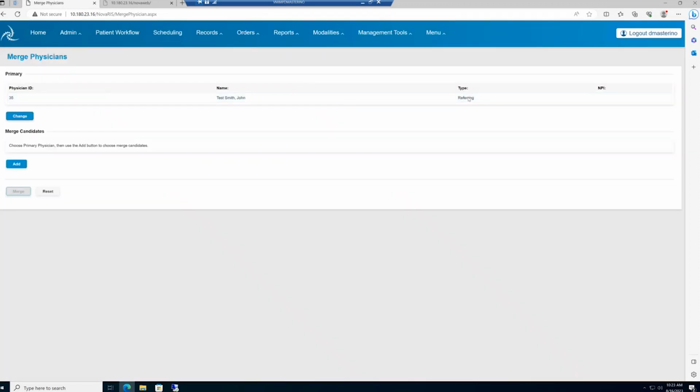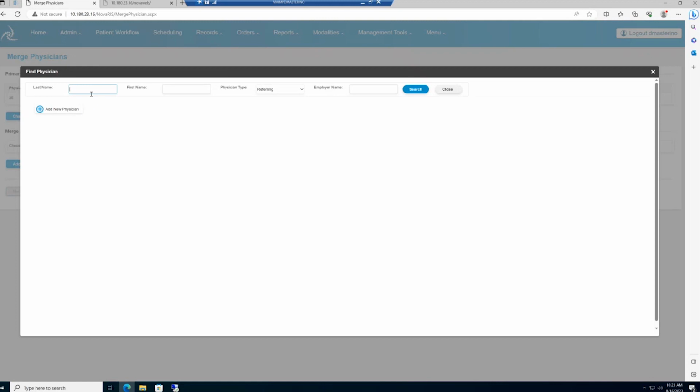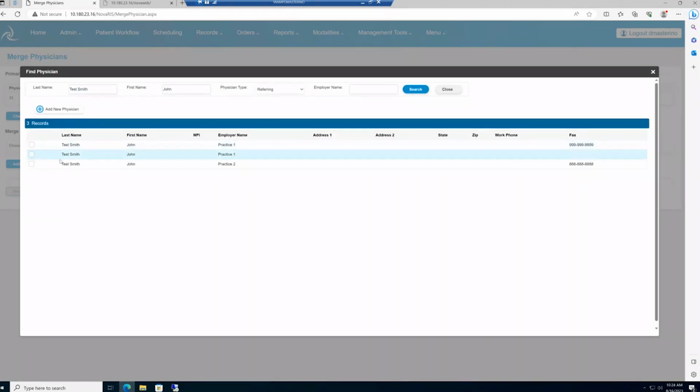I'm going to confirm here it is a referring physician. And then I'm going to add the physicians that I want to merge together. We very frequently had 3 or more doctors to merge together. It probably would have taken us a long time to clean it all up.